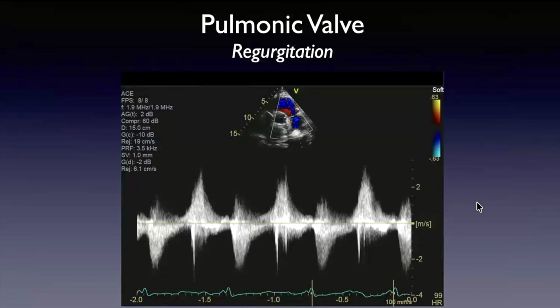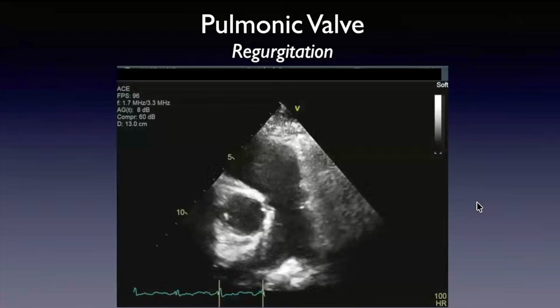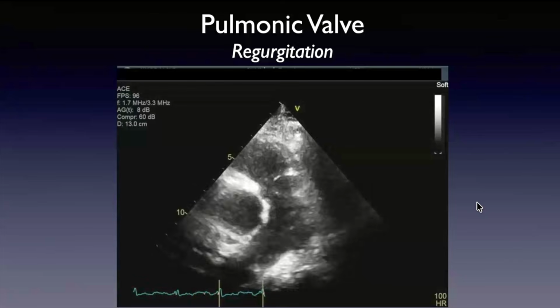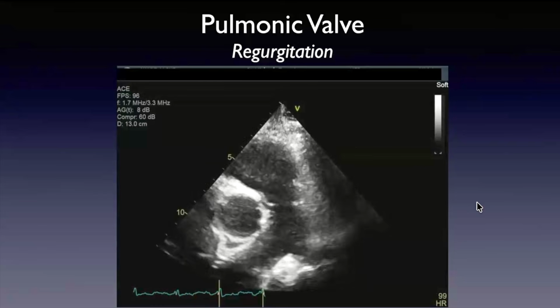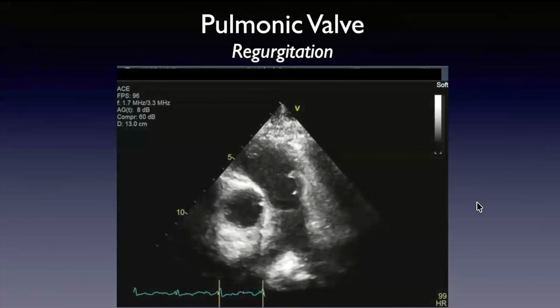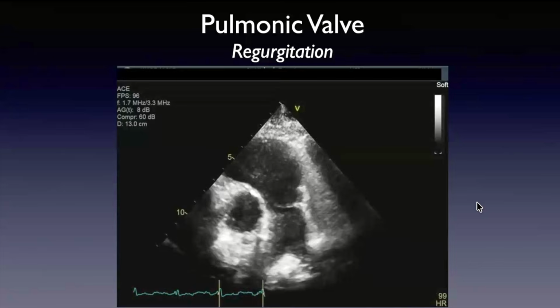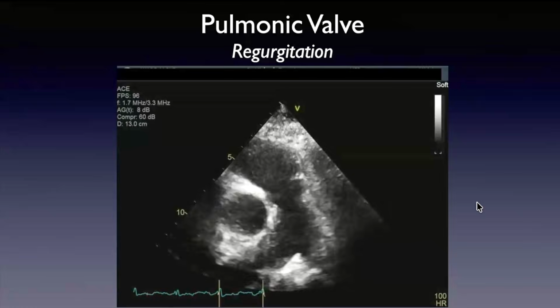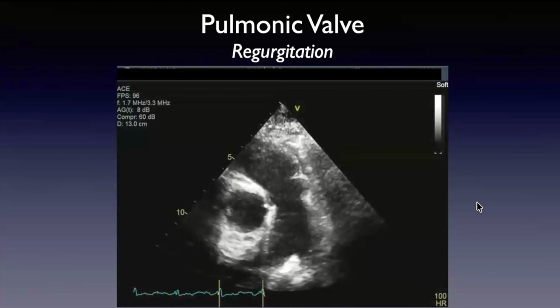And then you've got to go and interrogate: why is there this severe PR? I actually don't know the etiology of this one. I was looking through the chart. The patient had cirrhosis, coronary disease, a prior STEMI, and had heart failure as well.